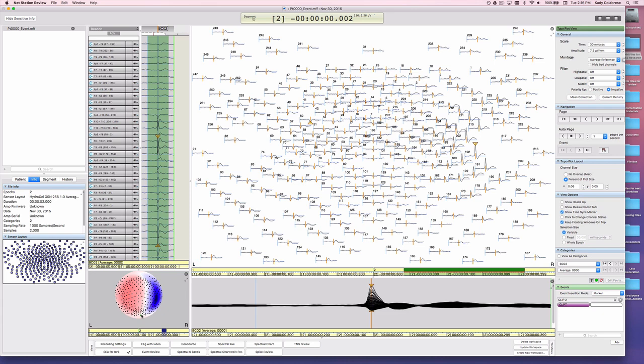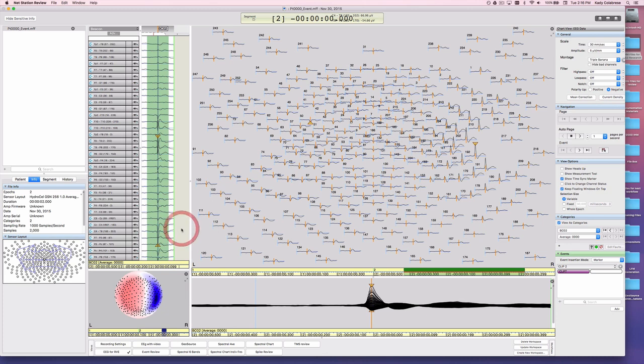Click on Chart View to make it active. The reciprocity visualization environment will pull the EEG data from this default chart view to make the calculations. It will send the following information: data for all sensors in your file, not only the ones being viewed in the chart view montage. Sensors marked bad will not be used to compute the scalp interpolation or source calculations. Viewer filters, and mean correction setting.